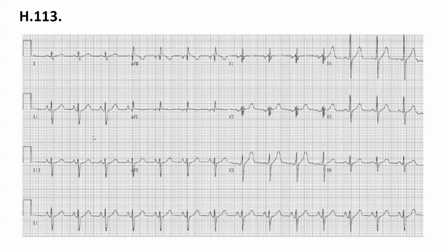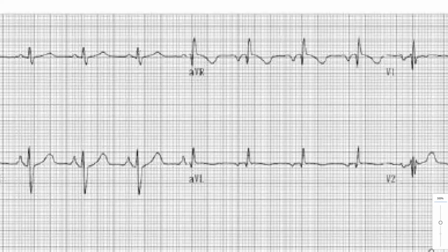Meaning, what can it be? The QRS is narrow, or a little bit, okay, that's narrow. Looking at lead number 1, the first part is narrow, but the second part a little bit wider, yes? But in millimeters, let's see, one, 2, it's not wide. So this is still in a normal range of the QRS complex, okay?